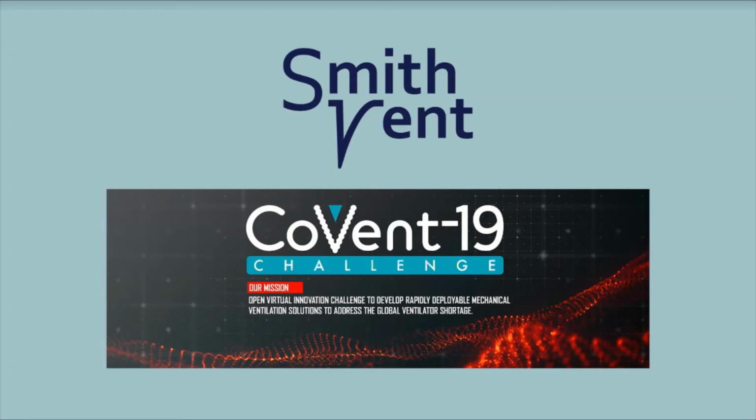In this video, I will be walking you through SmithVent's user interface and talking through some of our decisions to ensure our system is easy to use for healthcare professionals.